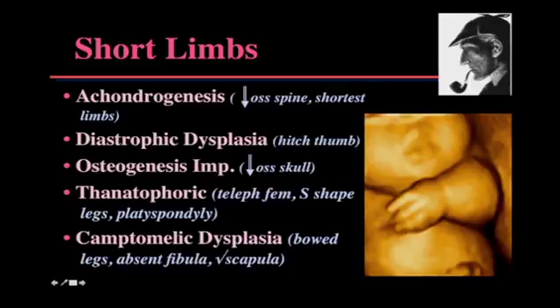Probably the next most common is osteogenesis imperfecta type 2, or congenita. And again, the bones are very abnormal and all broken, but sometimes they're hard to distinguish from the bowed bones because sometimes when bones are broken, they can heal in a sort of bowed position so that it may look like thanatophoric. But what will nail this diagnosis is the decreased ossification of the skull, which is very dramatic and gives you a look inside the brain that is much better than we otherwise see.